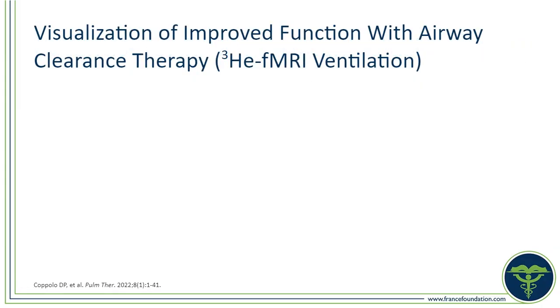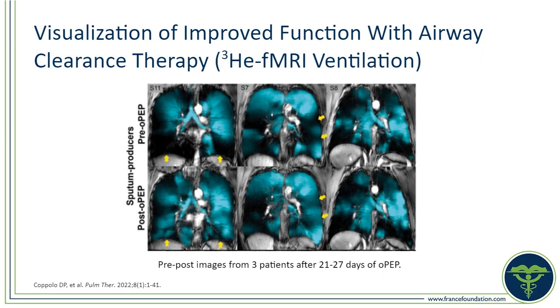From the clinical perspective, these imaging modalities do help highlight the pre and post airway clearance changes that can occur. You can see on the top part of the images, this is prior to a patient using their airway clearance devices, which they were using positive expiratory pressure devices. And then on the bottom part of the images, it's looking at the post airway clearance devices. And as you can see, there is some improved ventilation, which correlates a lot with our clinical practice where patients are more effectively clearing their secretions to help improve their ventilation.